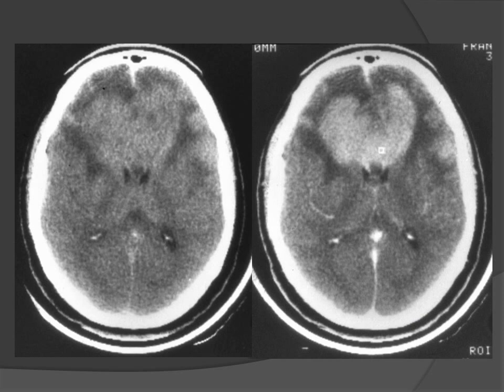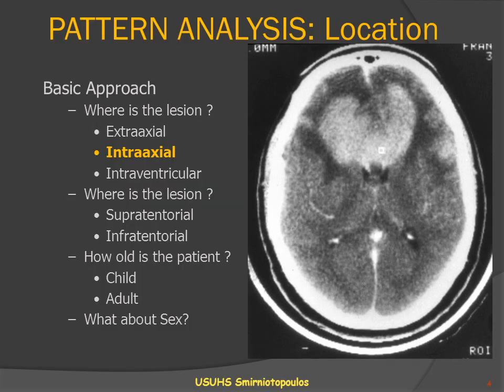So here we have on these two CT scans an example of a classic butterfly lesion. The non-contrast CT scan shows a fluffy, relatively homogeneous lesion of abnormally increased attenuation with some surrounding vasogenic edema. The same lesion demonstrates contrast enhancement.